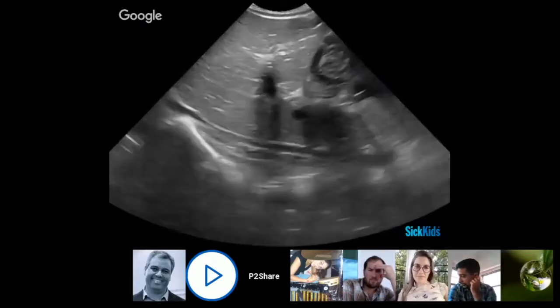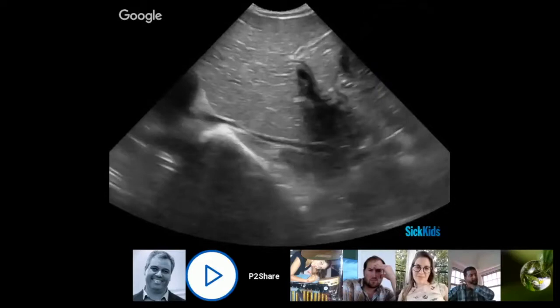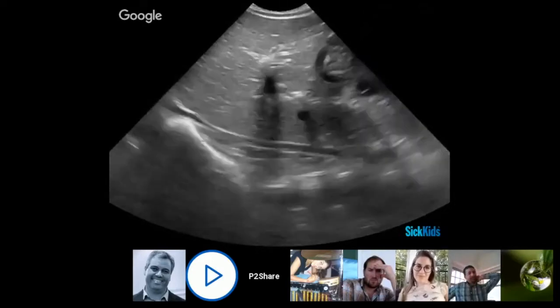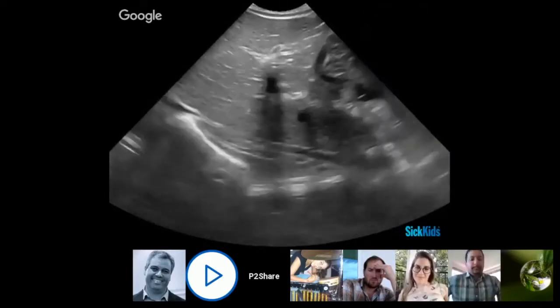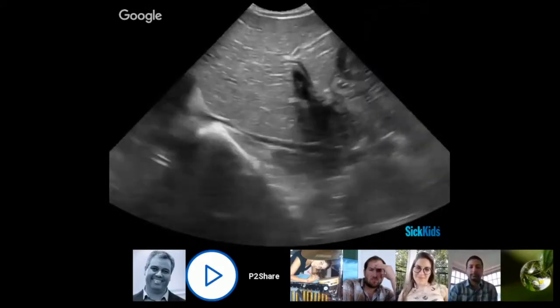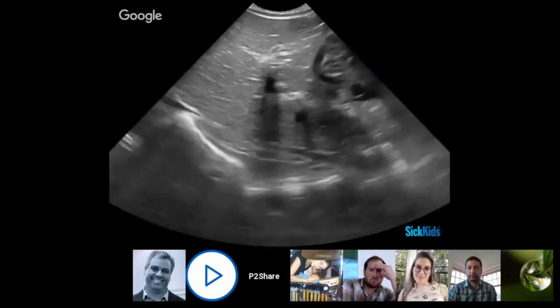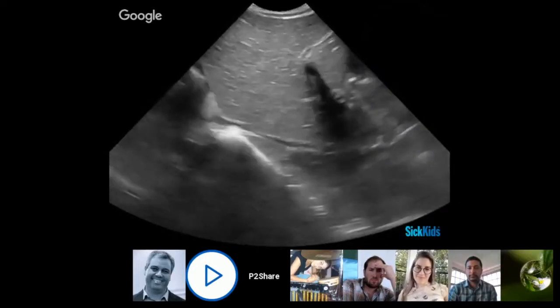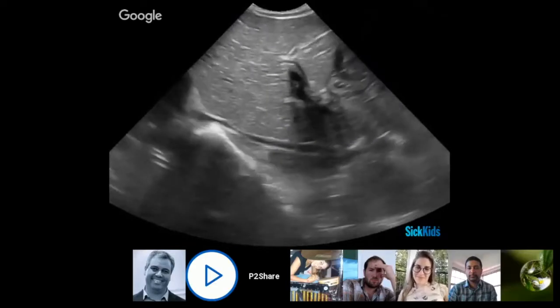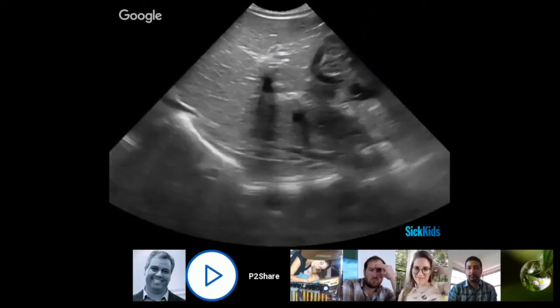The problem we have with these percentage determinations is that we don't really know what the normals are, particularly for kids, and it can be quite variable with respiratory mechanics. And so things like the Caval index have not really been shown to be too predictive of giving us evidence for fluid responsiveness. So most of us who are doing this on a regular basis are not typically measuring a whole lot of stuff.